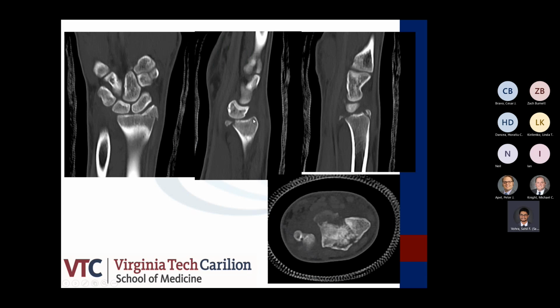Even though it was a dorsal dislocation, he was now subluxing volarly, along with just that tiny little volar fragment there. And we can see the step off of that styloid fragment as well. And then that dorsal rim fragment was also very small. And this is the axial cut where you can see that volar piece and then the dorsal rim as it's coming off.